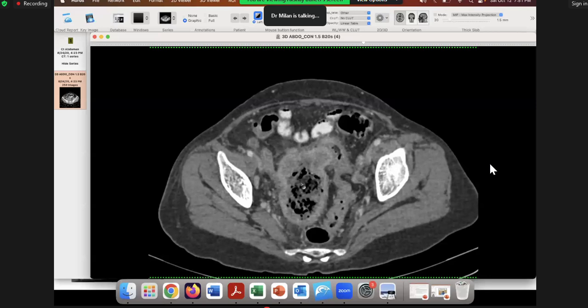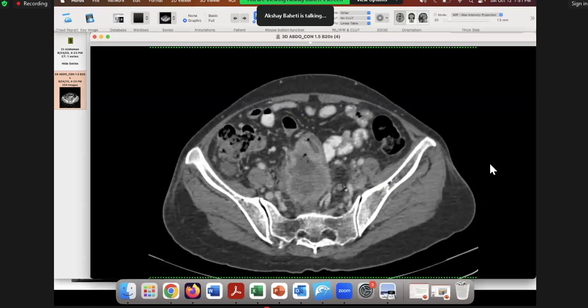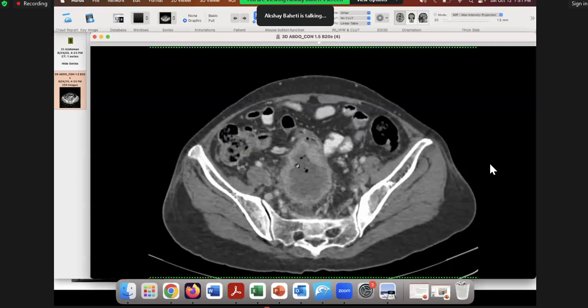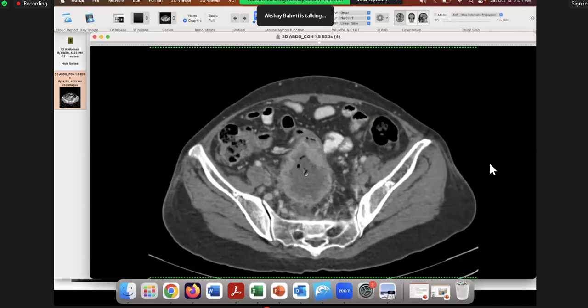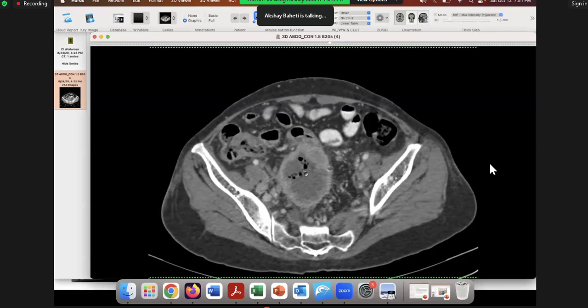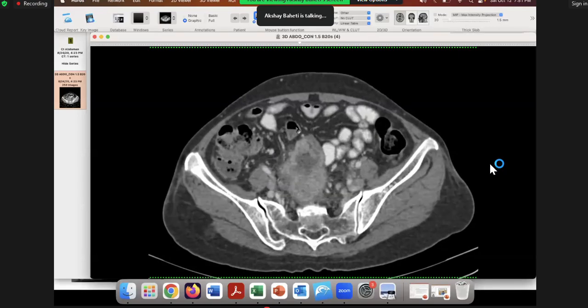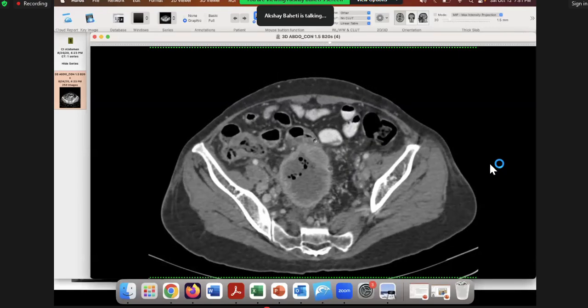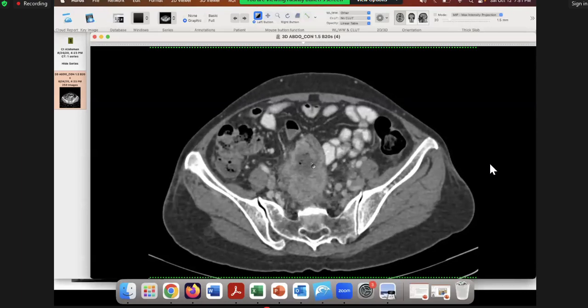Sir, could this be aneurysmal dilatation of the wall, which we see in lymphoma? Yeah, that's a good point. So generally, what you are seeing is something which is communicating with the ileal loop. But is all of this continuing with the ileal loop? Maybe this part is, right? This part you can see it's continuing here, right here. It goes inside this. You see this? Yes, sir, involved there.